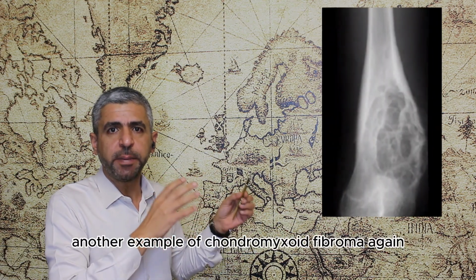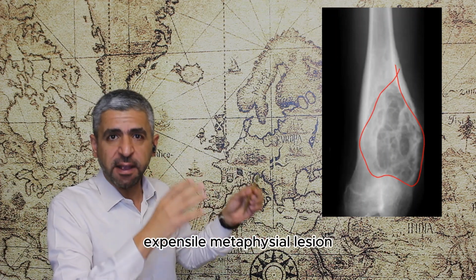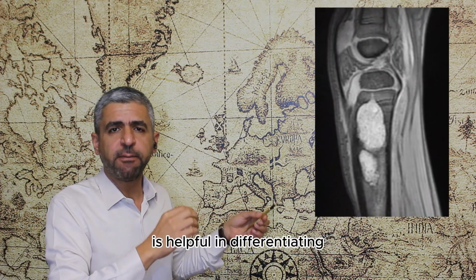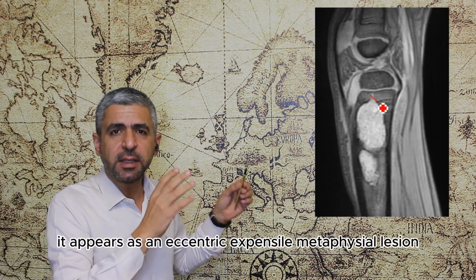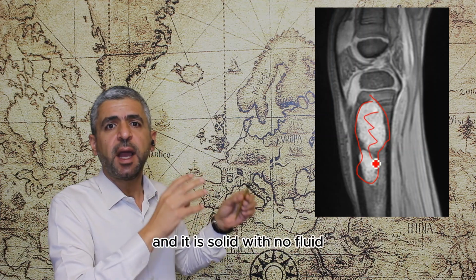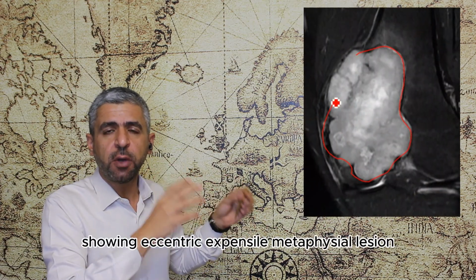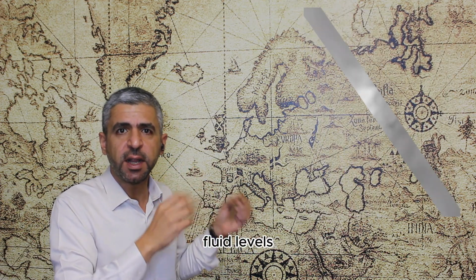Another example of chondromyxoid fibroma, again, it appears as an eccentric expansile metaphyseal lesion, and it is indistinguishable from aneurysmal bone cyst. This example shows how MRI is helpful in differentiating chondromyxoid fibroma from aneurysmal bone cyst. It appears as an eccentric expansile metaphyseal lesion, and it is solid with no fluid levels. Another example of MRI of chondromyxoid fibroma showing eccentric expansile metaphyseal lesion that is solid with no fluid levels.